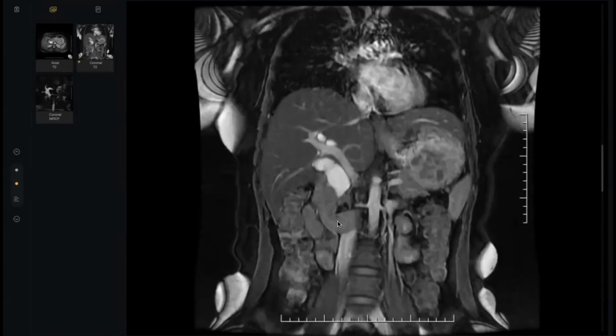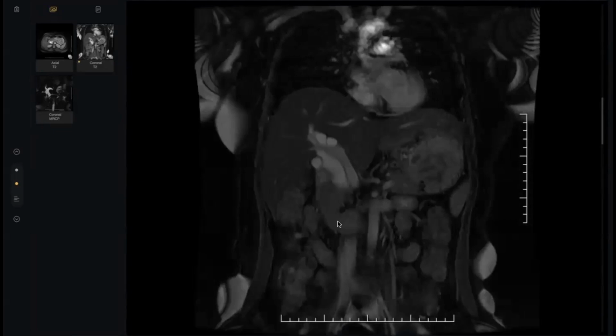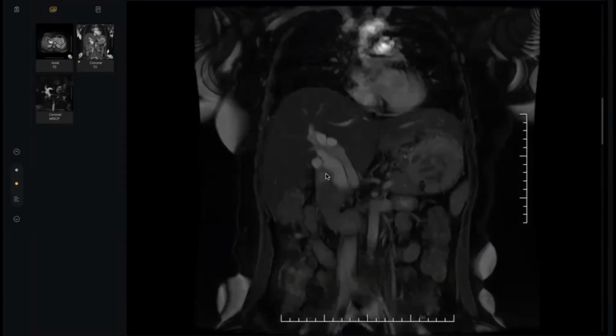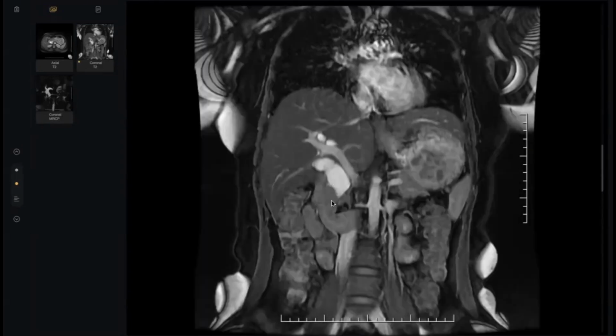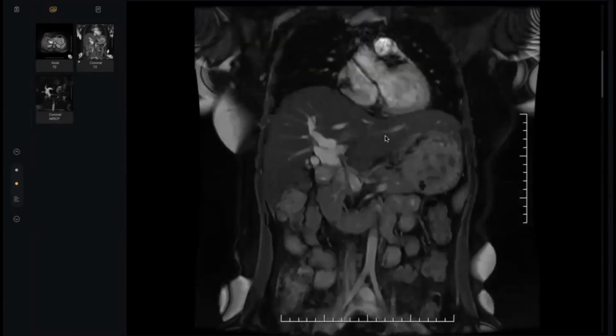This is non-obstructed dilatation. This is the point of differentiation. Marked dilatation of the CBD and the central biliary radicles without obstructing stone or masses, and not associated with peripheral dilatation. Overall, the periphery looks normal. So your differentiation is a choledochal cyst. This is a choledochal cyst.